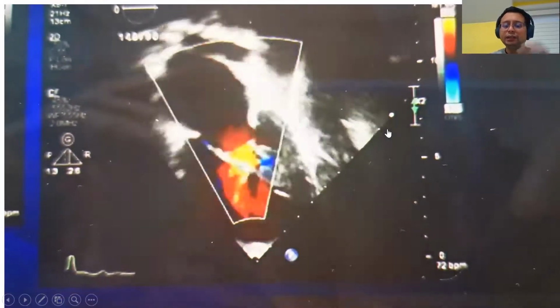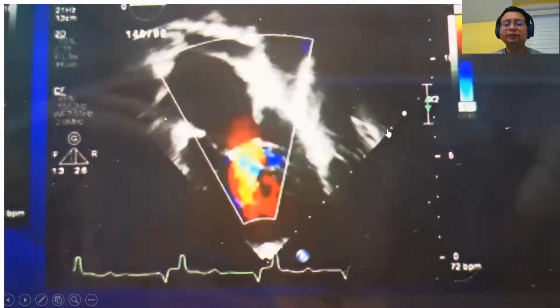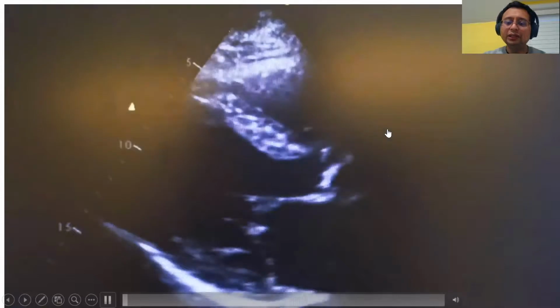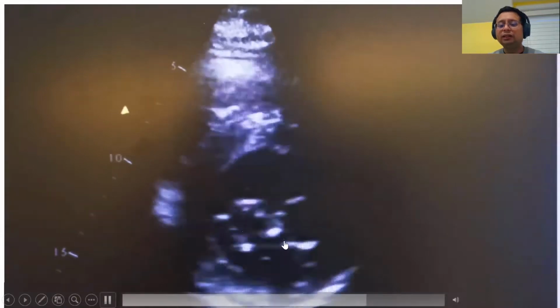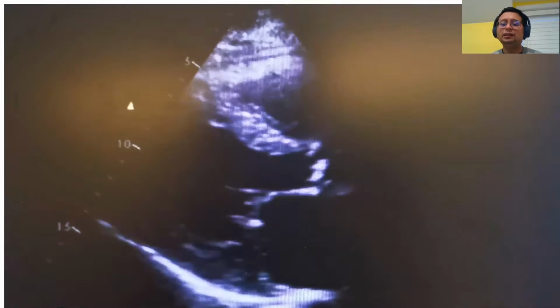So this is the same patient with mitral arcade and also mitral stenosis. That is mitral arcade. That's another example here. So that's quite a different patient with congenital stenosis, double orifice mitral valve leaflet. So the mitral valve leaflet has a double orifice. Okay, this is congenital disease.